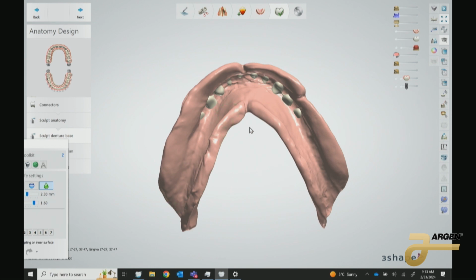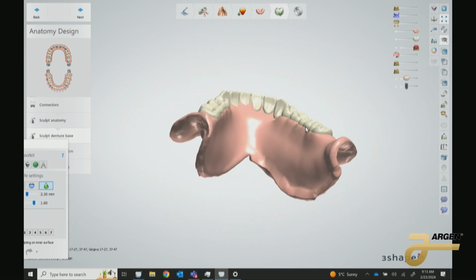This is extremely valuable when you're doing a suction denture from a good impression. This material should not be trimmed in. That is allowing suction on your lower. It's very, very important. I did carve out a little bit here.